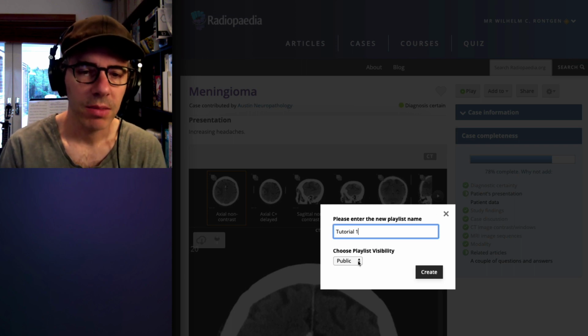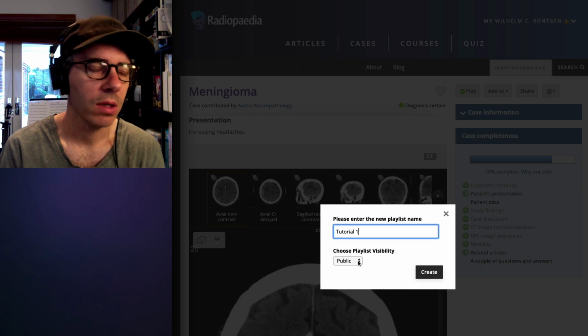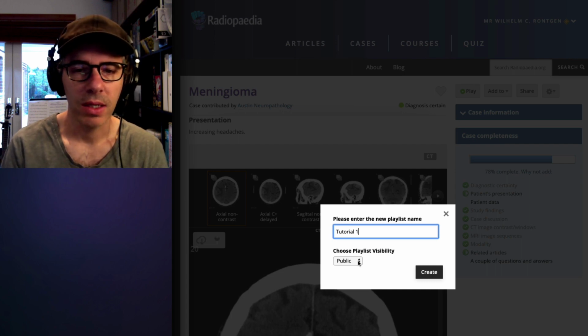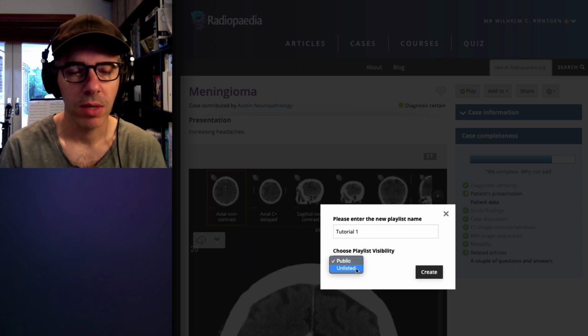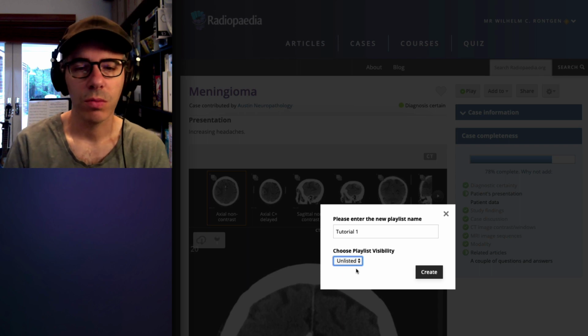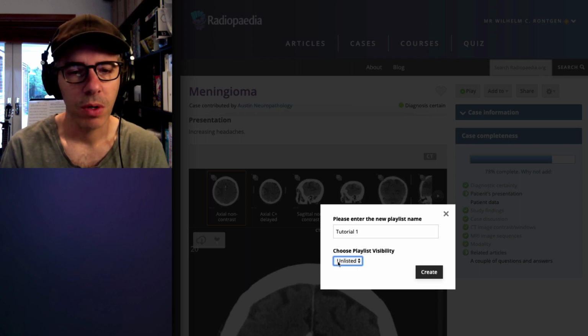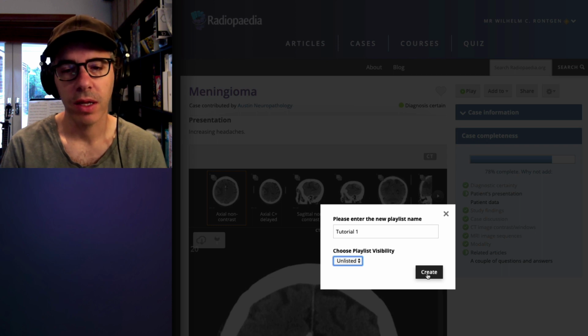Now, if you choose public, anyone would be able to see your playlist, which, depending on your mindset or your trainees, you probably would rather keep unlisted, at least until after the tutorial. This means that it won't show up on any searches of Google or of the website itself, but you can still share it, and we'll cover that a little bit later on.